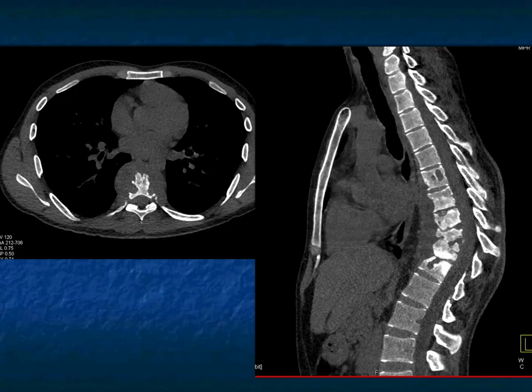We don't think about TB as much as we used to perhaps, but TB can present in the year 2023 as back pain. We talk about TB as a cause of hematuria. We talk about TB for hemoptysis, but also back pain, Pott's disease. So paraspinal mass, I'll think of lymphoma. I'll think about neurogenic tumors, but I'll also think about infection with IV drug abuse, infection in E. coli, but typically you have a discitis. Here there's discitis, but there's destruction of multiple vertebral bodies.